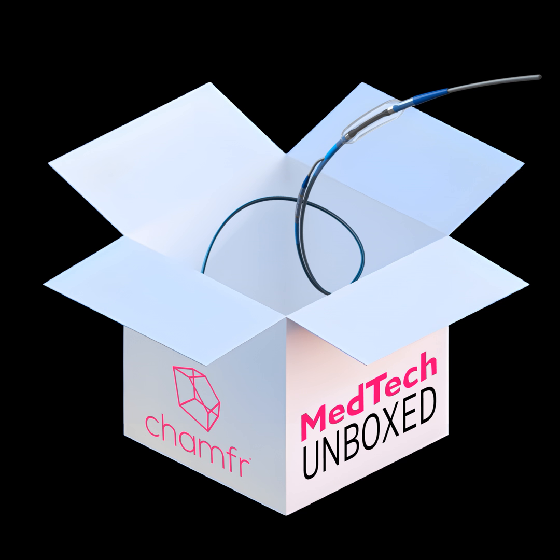So what I did actually is I went to Chamfr and looked at every extrusion you guys offer and filtered it by the most common and took the first 50 or so and went to pull the data sheets for each of those. So not every polymer will be in there, especially not every complex polymer, but the material library lives on your computer and you can add or modify as needed with your materials, with your polymers.